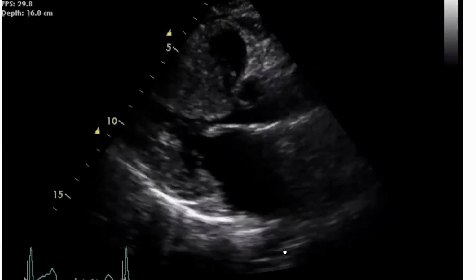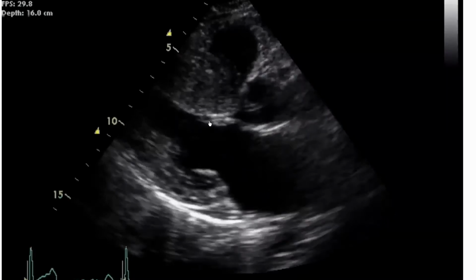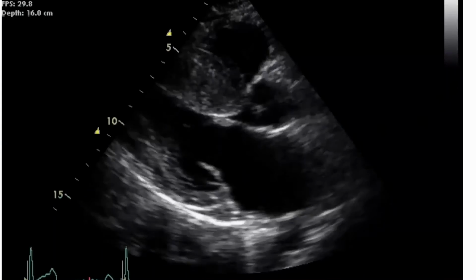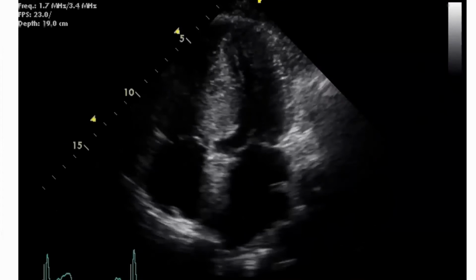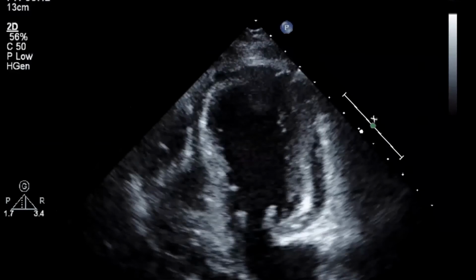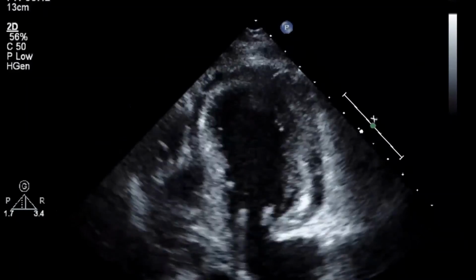So I just dug a few out of the drawer. Some of the memorable ones. Here's a big chunk of steak in the basal septum. But as you can see, there's not a huge amount of SAM there. And if anything, maybe just on the chordae. And another one, this one takes a bit of time to load, and you can see there's fairly significant SAM at the leaflet and the chordal level.